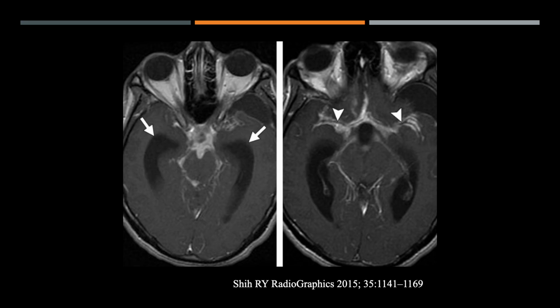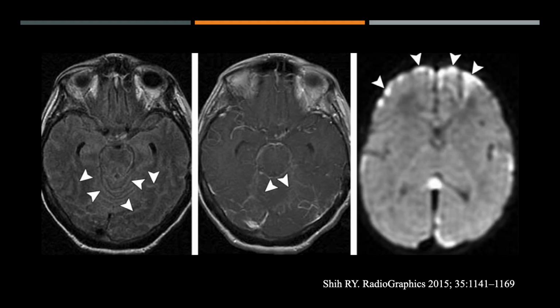What's the finding here? Here we have a basilar predominant leptomeningeal enhancement. Our differential is a bit more specific. We're going to think about sarcoidosis. We're going to think about tuberculosis. This is a case of tuberculosis meningitis. You can see hydrocephalus too. This is a case of meningitis where we can actually see leptomeningeal enhancement. Often we won't see any findings with meningitis, but here we do.